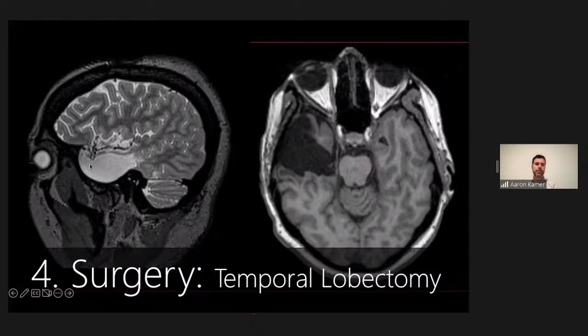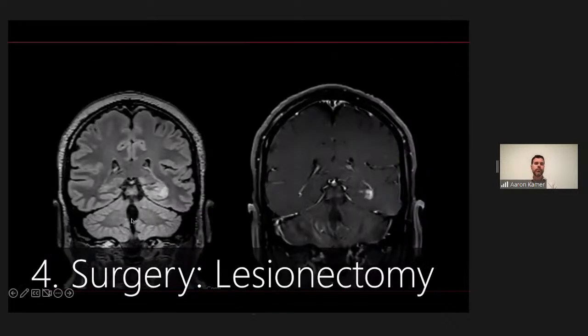So the surgeons are typically going a specific distance back in the temporal lobe. They're usually resecting as much as they can of the hippocampus and amygdala, being primary seizure-causing organs. And sometimes you'll see small amounts of medial temporal lobe or small amounts of hippocampus that are left behind in the surgery. That's fairly common and may or may not be intentional, and may or may not be what the surgeon would ideally have liked to do, but maybe they knew that they had to because of some anatomic considerations.